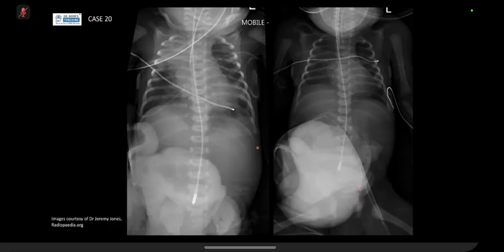And yeah, okay. So maybe the stomach seems continuous with the structure on the right side of the abdomen, which could be externally from this patient's abdomen. Yeah. So what do you think is going on? I think the bowel loops are extruded from the abdomen. Exactly.